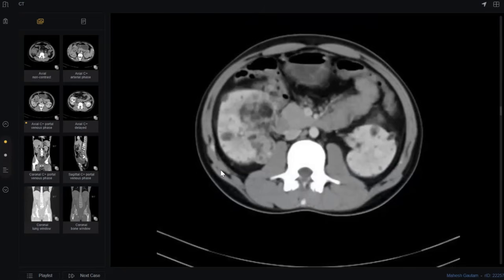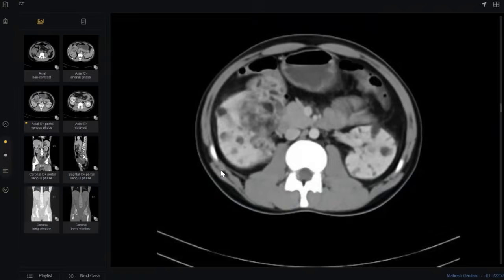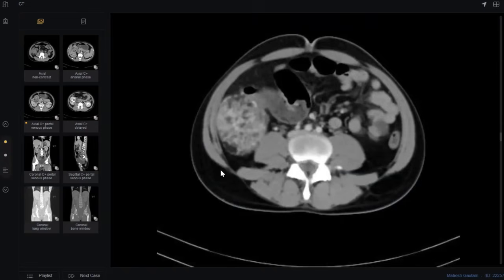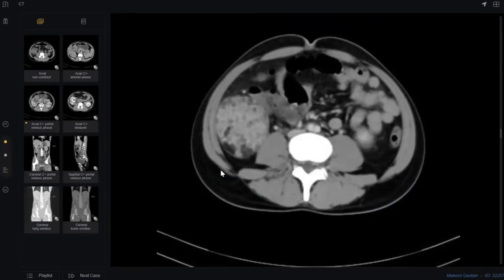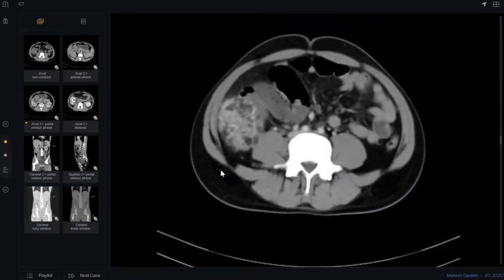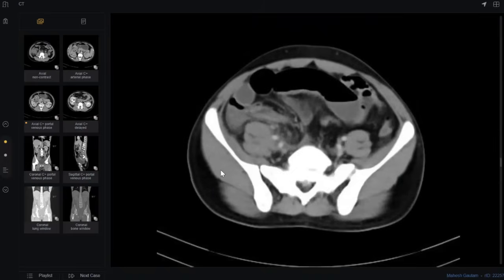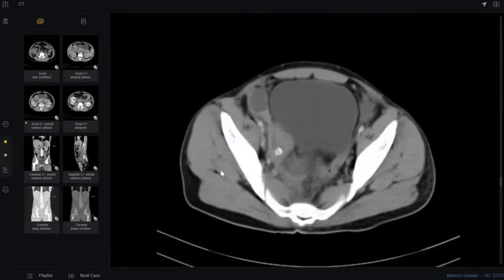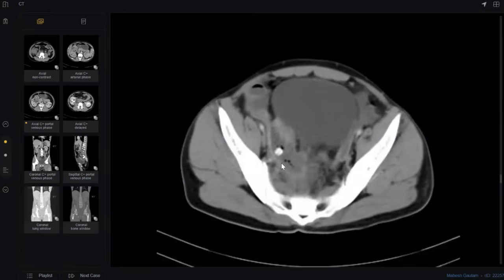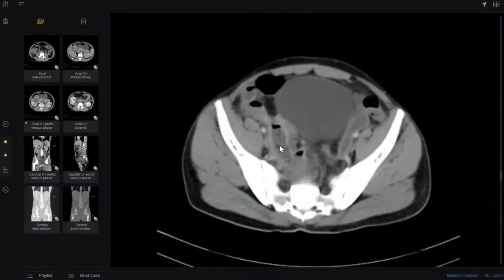Besides that, I told you many times before, when the examiner gives you a very easy case, expect something, especially not the first case. The first case is usually like this, very easy. But if this is the middle or the end case, think about the complaint more. Look here. If you look here, you will find the appendicolith, collection and the tubular structure. All this is the appendix.